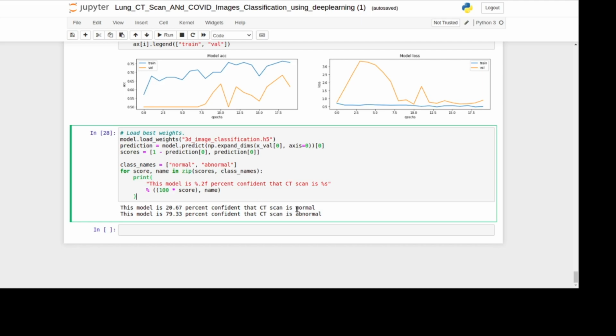Till now, you will know how to classify 2D images, how to access them, how to pre-process them, and how to use them as data for your models and train the models. But now it is not that easy when you need to work with multidimensional images, especially 3D images. So how are we going to do that? Initially I will show the result.